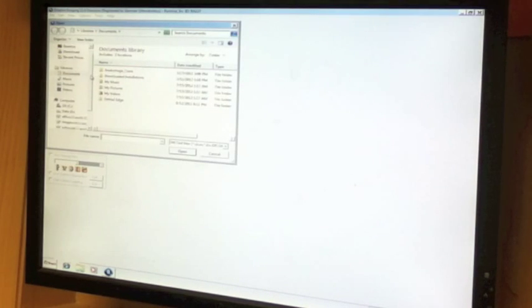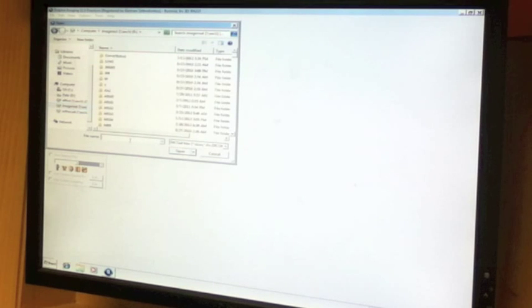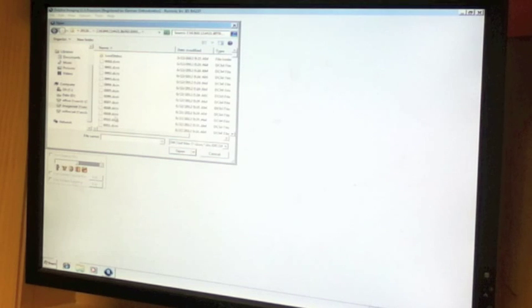You'll navigate to the storage location on your computer, search the patient's ID number, choose the date of the scan that you'd like to use. Typically it would be today's date. Choose the top file, and any of the DICOM files will work. Double click those and it will start importing.